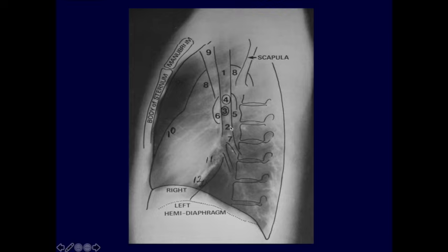From 1 to 6, the only important things I think you need to know are you have a trachea here, you have lucent circles, which are the upper lobe bronchi on both sides, and then anteriorly you have a density that is the right pulmonary artery, and posterior superiorly you have the left pulmonary artery density as well.